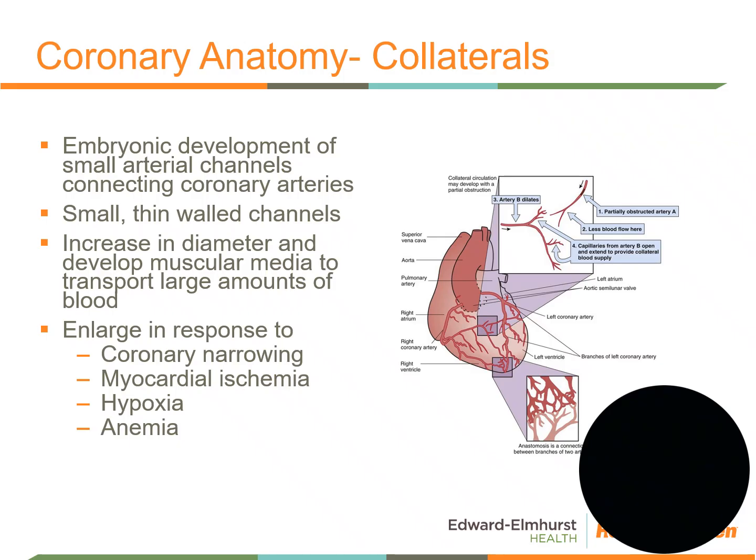These are not branches that are regularly visible or seen in normal anatomy. We often see these in CTOs, so the chronic total occlusion cases. When we see these, this is your body's way of accommodating this long-term blockage.